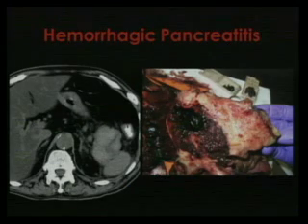High density, which means unlikely to be pancreatic adenocarcinoma, because we said that this is a tumor with a significant fibrotic component, it's usually hypodense. If we want to evaluate any kind of hypervascular tumor in the pancreas, we have the neuroendocrine tumors, but they are not like this. Usually they are smaller, well-defined, pretty bright.